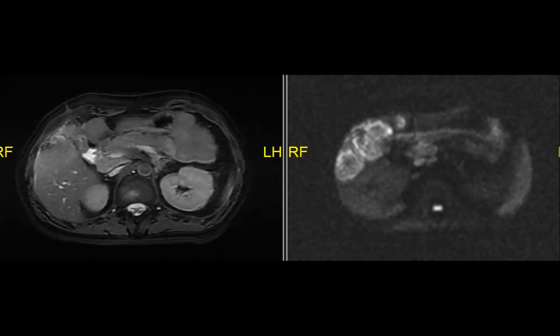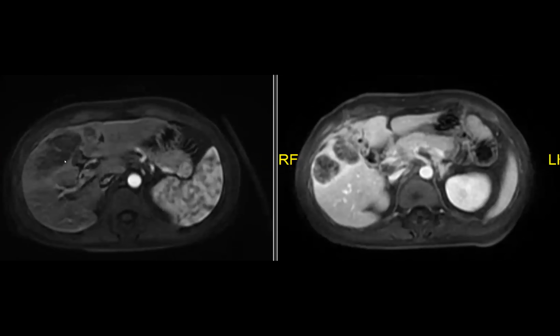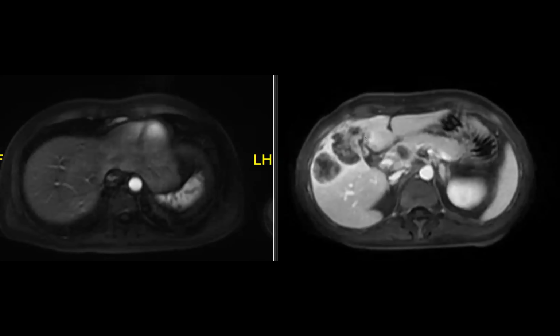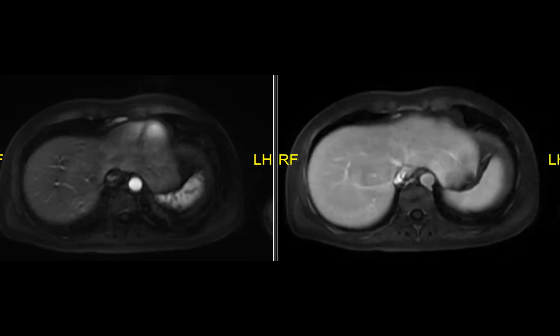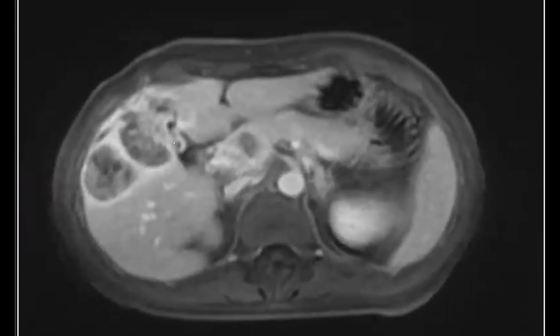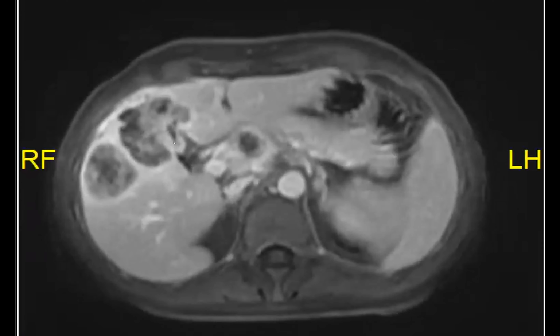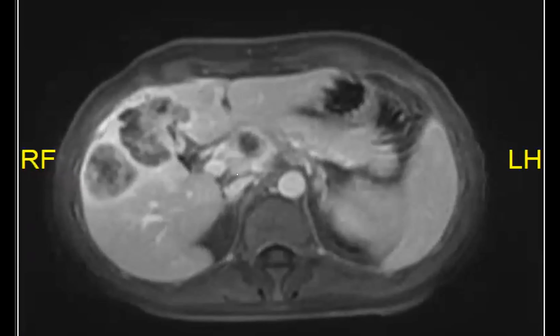Then here's the post-contrast. You can see early on, there's not much enhancement, right? And then as you progress, there's more enhancement in these lesions. Let's just extend it to the delays. Here we go. This is a delayed phase, again more and more enhancement. So this was read as worsening abscesses despite presence of the catheter, and no lymphadenopathy.